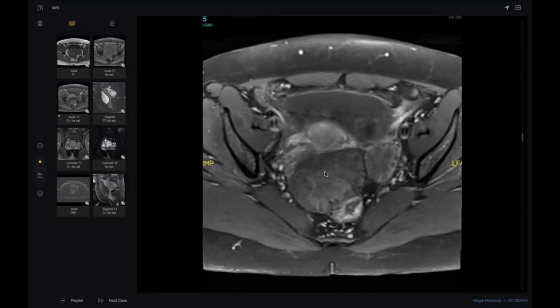Thank you. Why can you detect some enhancement in the torsion? Because due to engorgement of the vessels, the pedicle is still vascularized. So it is another cause. I mentioned the cause in the beginning of today's session.